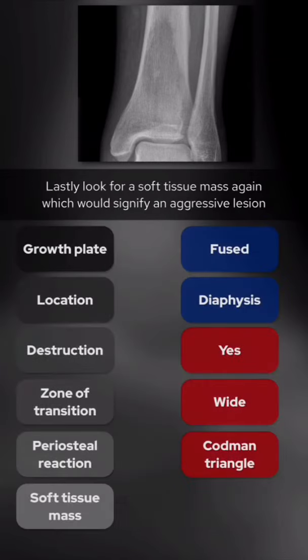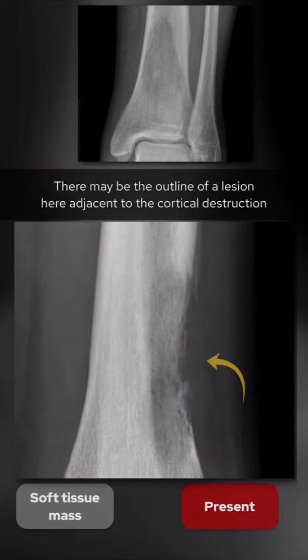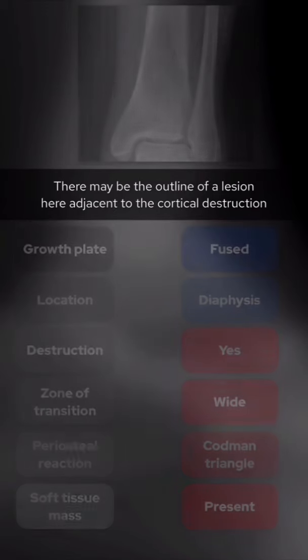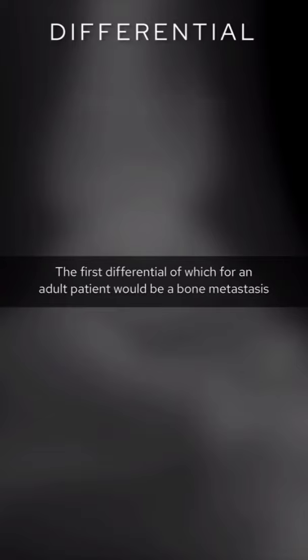Lastly, look for a soft tissue mass, again which would signify an aggressive lesion. If we look closely at the lateral view, there may be the outline of a lesion here adjacent to the cortical destruction. The destruction, wide zone of transition and Codman triangle all point to an aggressive lesion. The first differential of which for an adult patient would be a bone metastasis.